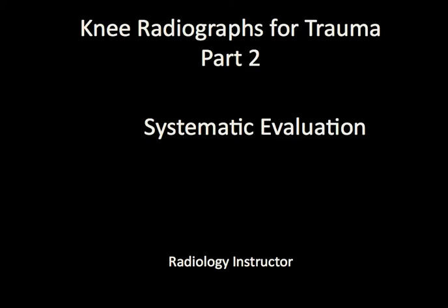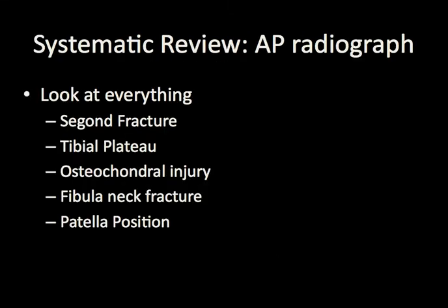Hi, welcome to part 2 of Knee Radiographs for Trauma. In this part, I will go through a method of systematic evaluation of knee radiographs for trauma. It is important to have a method whenever looking at any radiograph.